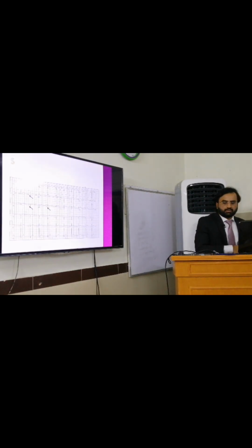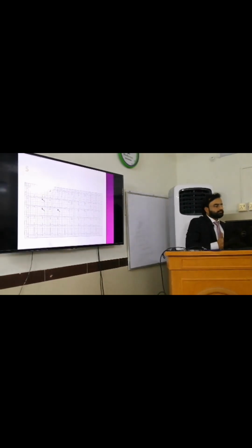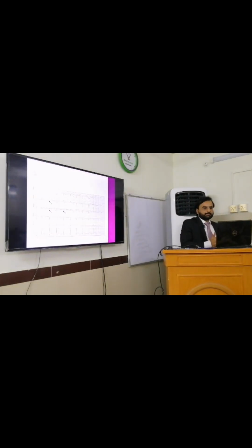So here you see the narrow QRS complex with the inverted P waves preceding the QRS complex, right? So what would you derive from this ECG tracing? How would you interpret it? You would say that there is an atrial rhythm actually. It's not coming from the SA node. It's coming from the atria. That's why the P wave morphology changes. You see, it's a low atrial rhythm.